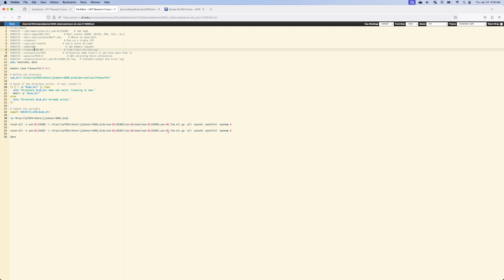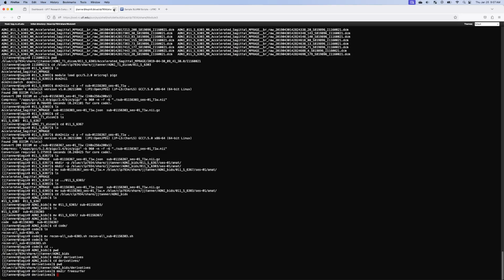Hypergator, we can run a lot at a time. And in that case, there would be some other modifications to this. But this is okay as an example. So I'm going to save that. That'll do both of them. And then I can close it. Notice I didn't get an error, but to be safe, copy, paste if you're using this, and we'll close it.